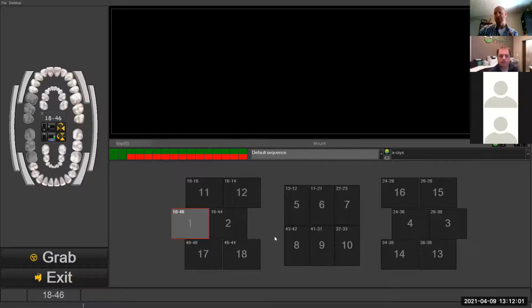Yeah, what we've done is, a lot of the softwares initially that we dealt with had individual exams that started to be taken by date. And this really wasn't a very smart way to do things, in our opinion. And this is one of the things that DEXIS developed, and was quite progressive in their thought, is that they had one mount that was chronologically placed, and then everything behind it is chronologically in order. So you have one mount here, but you can override.